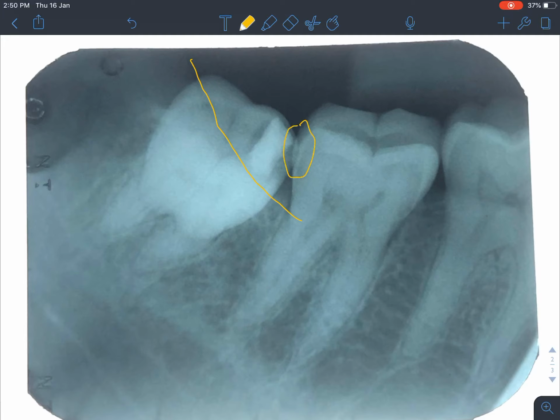So there is contact in that area, because of which, like you said, if you were to draw the long axis of this tooth, can you point out the long axis of this tooth and the long axis of the adjacent tooth? You see that it's not possible for the 4-8 to erupt, because the path of eruption is obstructed by the 7. Yes.